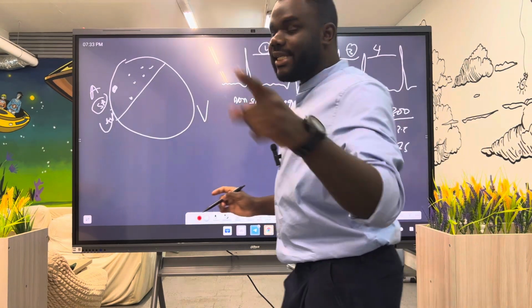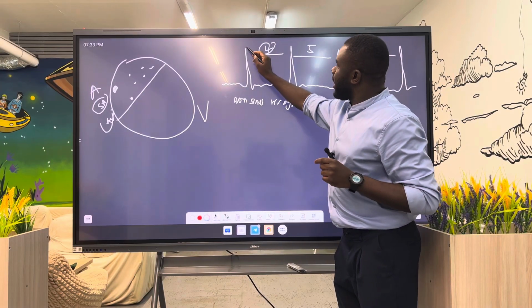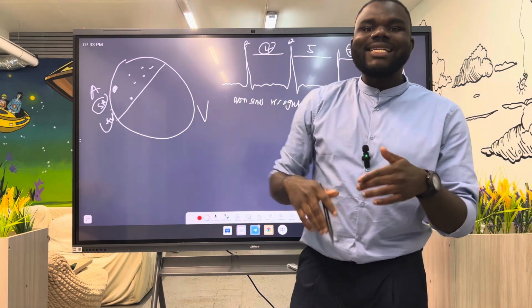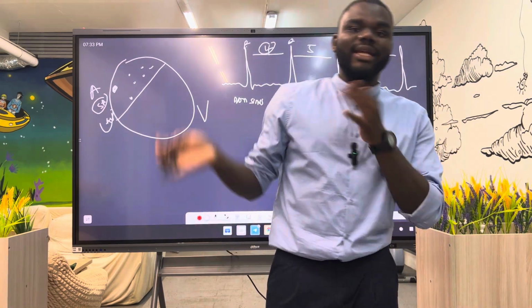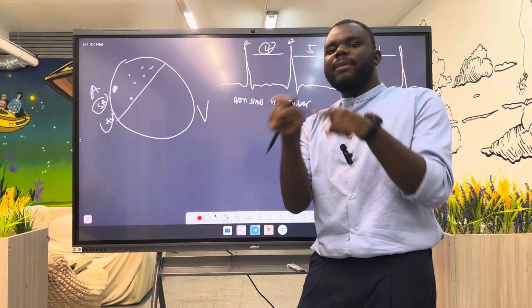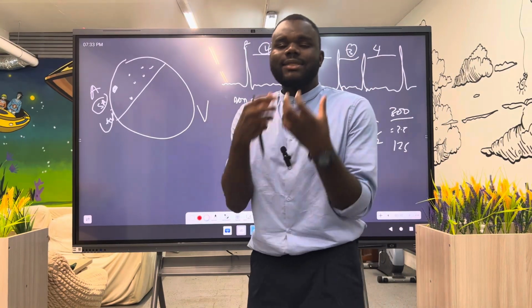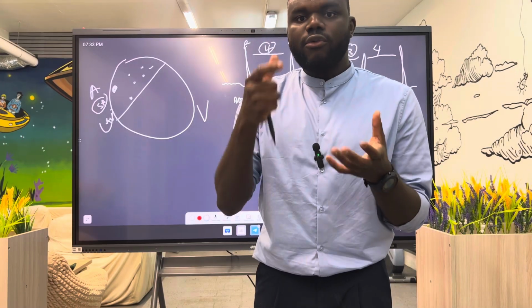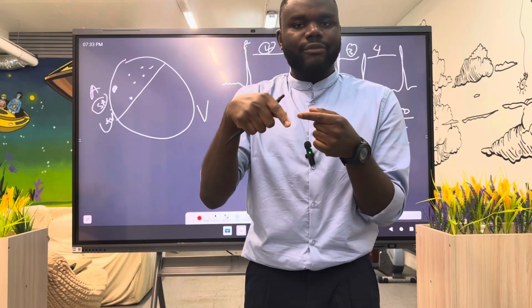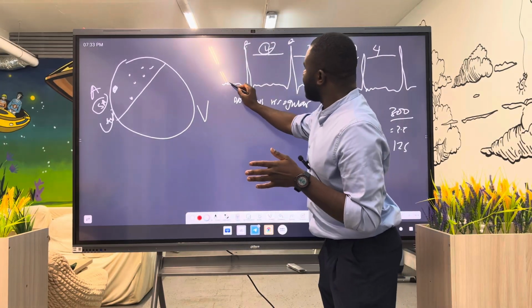But when you are calculating this, you should always think, because this QRS, you are calculating from the RR interval, and the RR interval is the ventricular rate, not the atrial rate. If you want to calculate the atrial rate, you need to calculate the distance between the PP interval. But for atrial fibrillation, the heart is contracting so fast that it looks like it is fibrillating. The atrium itself, not the ventricle, has the problem. Hence, that's why we have this wave here.